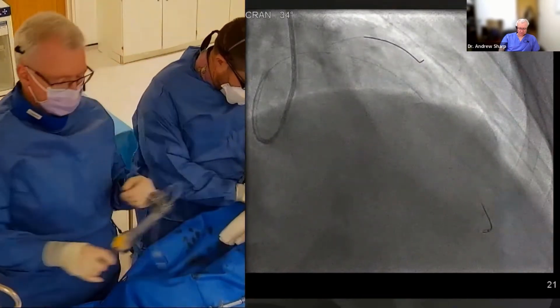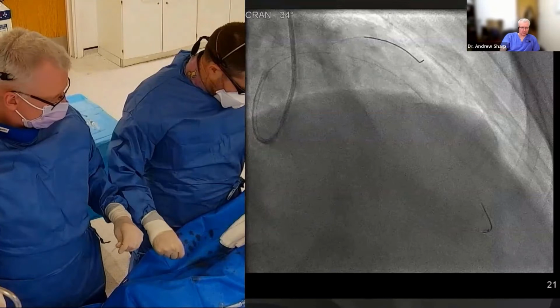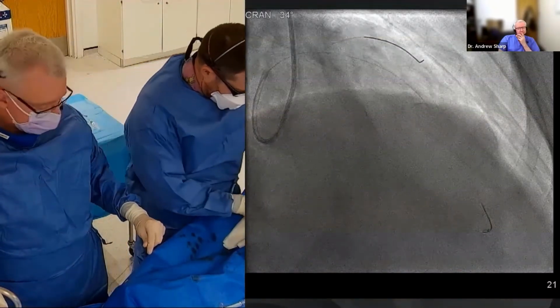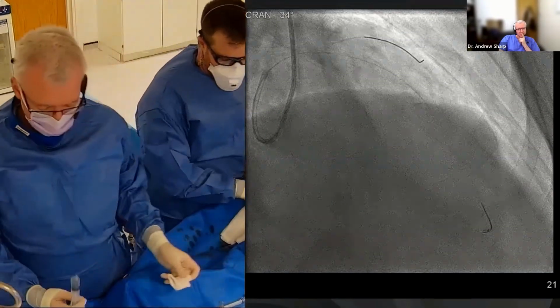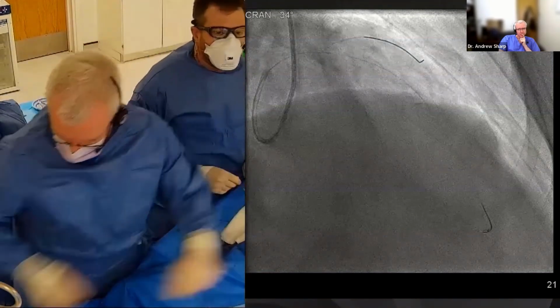I think that's really good practice now when you're dealing with any kind of calcium. IVUS, I think when we started using it, was there to size stents and look at morphology, but actually I use IVUS to guide every step of the procedure. I do a lot less angiograms and a lot more IVUS. Okay, great. So let's have that back.